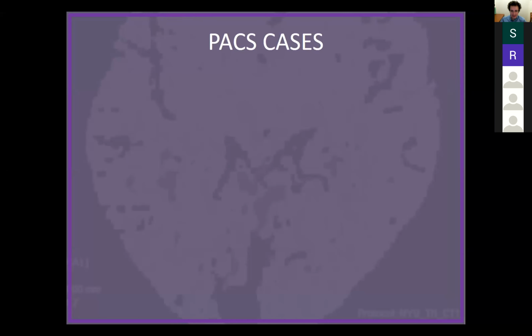Now we're going to switch gears a tiny bit, and I want to do what I told us we're doing. We look at the MR or CT, and then we put the angio side by side. I want to show a little bit of that. It's a nice way to do that because in Zoom, you can just show images through the PACS. So let's see if I can share this screen.